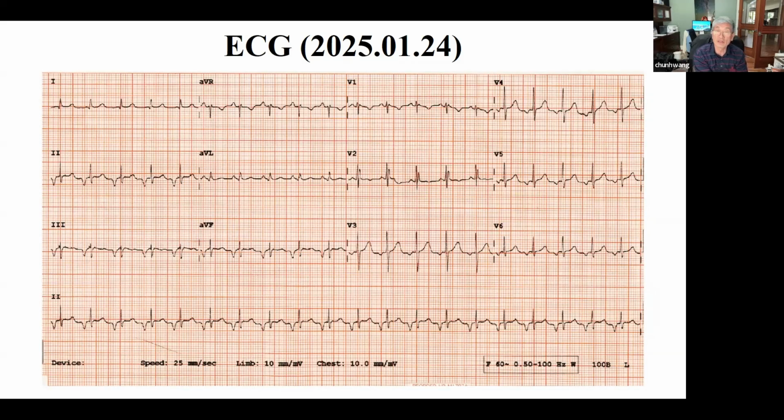Besides ectopic atrial tachycardia, what kind of tachycardia can produce this type of P wave, a deep P wave in the precordial leads, and also negative in 2, 3, and aVF? They can have a long RP tachycardia, even though ectopic atrial tachycardia is possible. Another differential diagnosis is persistent junctional reciprocating tachycardia, PJRT. The rate would be slow, okay? But a PJRT alone would not do this. There probably has to be an underlying conduction abnormality together.